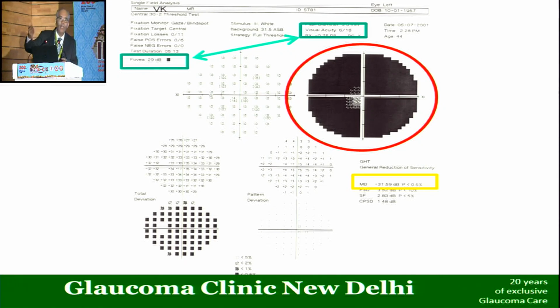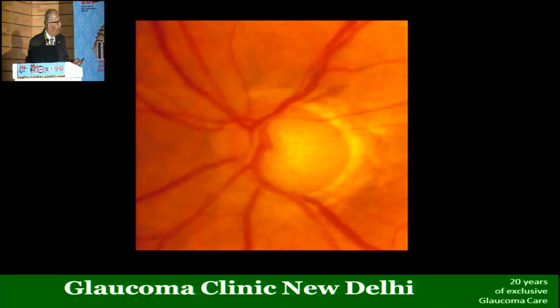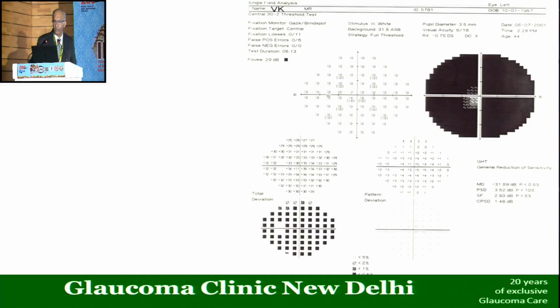And if you're thinking in terms of an advanced glaucoma, you would expect changes at the superior pole and the inferior pole of the optic disc. So when you see the optic disc, you find a shallow cupping and you find a splinter hemorrhage present superiorly. So this was a patient with an advanced glaucoma. If you break the sequence and jump just to the pattern deviation to pick up the damage, you're going to miss the glaucoma diagnosis here.